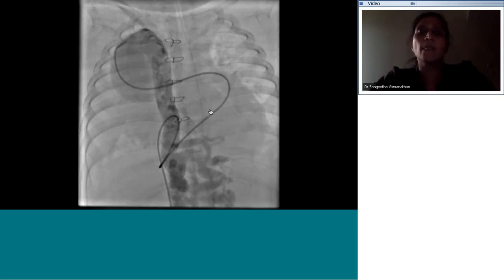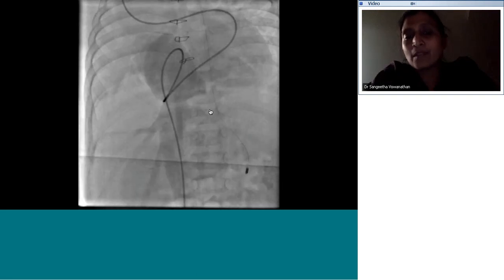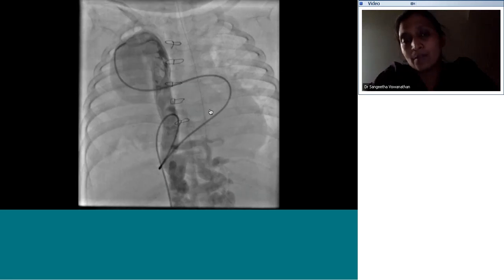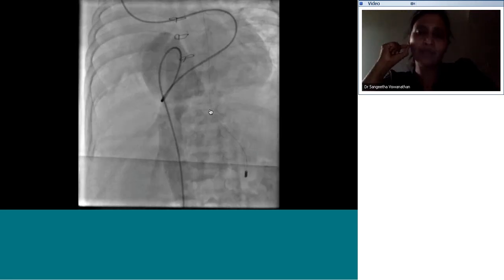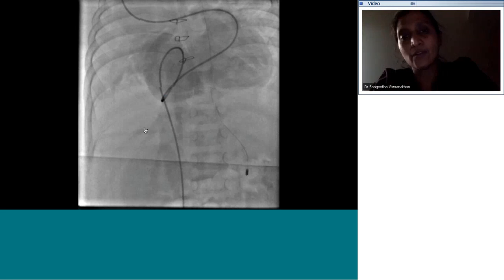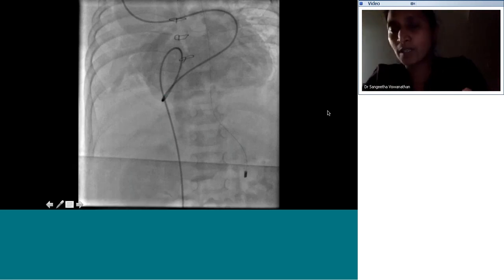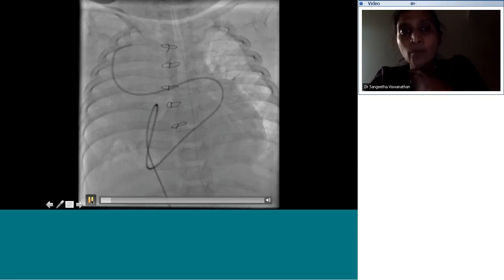Right, so describe the catheter course. Okay, if you look at the entire angiogram, there were no MAPCAs on that patient. Somebody had mentioned MAPCA for the previous patient, but we have not seen any MAPCA on the angiogram. What we saw was actually a PDA which had constricted. Okay, so now we move on to the next patient.